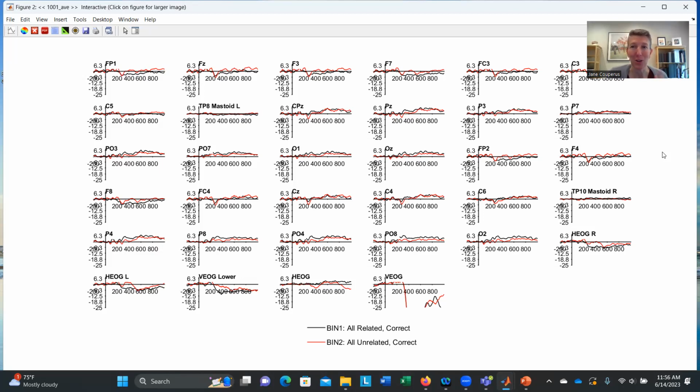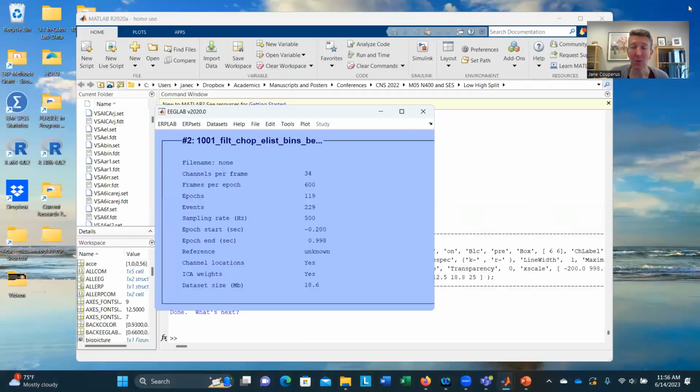Are there bad channels? Are there waveforms there? Is it looking really, really noisy? It all looks okay to me. So that is how we do an individual average. We also want to do a grand average. So I'm going to actually upload 10 more files so that we can actually look at those.